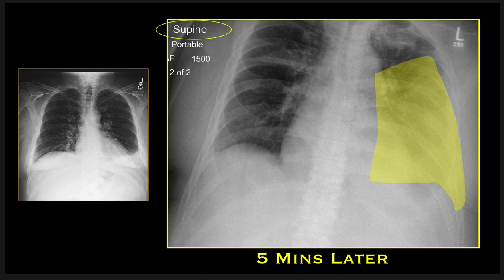That's supine. So this is a typical appearance of a supine pleural effusion. I also want to point out how difficult it would be to compare this. So if somebody was asking you, hey, is it worse? It's really apples and oranges, right? You would have to be practicing a really long time to accurately be able to say what volume on a frontal radiograph would stack up with the volume on a supine. Like I said, unless it was super duper dense, and then you would say, well, it's probably gotten more.